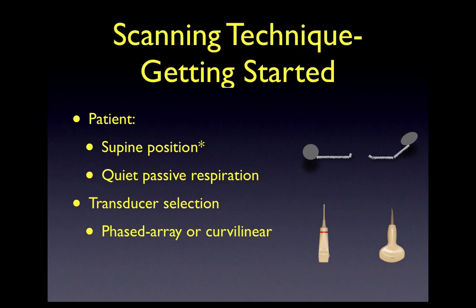Both of which have middle to low frequencies. Each of them has particular advantages over the other. So let's start with the phased array. This transducer here is nice for several reasons.